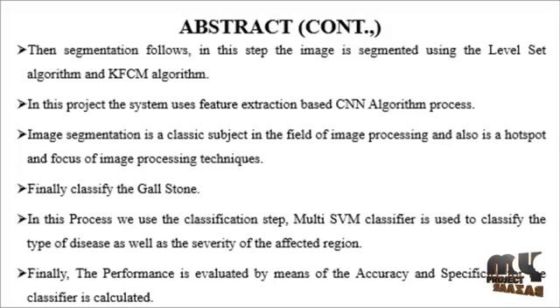Finally, classifying the Gallstone. In this step, the multi-SVM classifier is used to classify the types of disease. Finally, the performance evaluation is done, where the accuracy and specificity of the classifier are calculated.